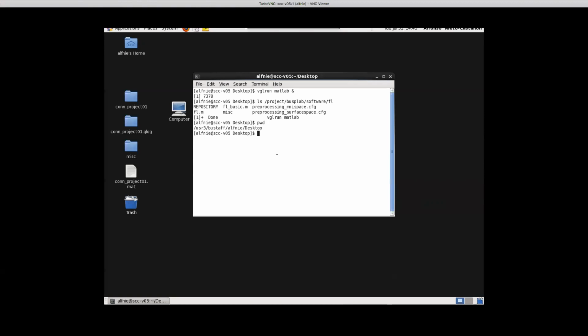We could export the data, import the functional data into a surface file in subject space that contains a variable number of vertices for every subject. And then we will resample that surface-level data using the LH and RH sphere.reg information into the MNI tessellation. The MNI tessellation is just this uniform tessellation in the sphere, because the sphere.reg files contain the information about how each of those vertices project into the sphere.